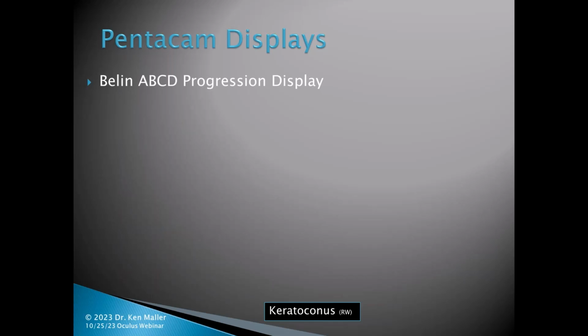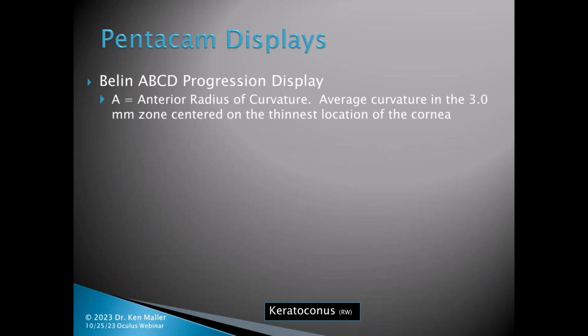All right, so one of the other displays that I find incredibly helpful is the Belin ABCD progression display. The reason this is so helpful is that Pentacam does really all of the work for you by pulling out the examinations that have been done over time, and essentially will display them next to each other so that you can see what things have progressed from the last time you saw the patient, or even further back than the last time.